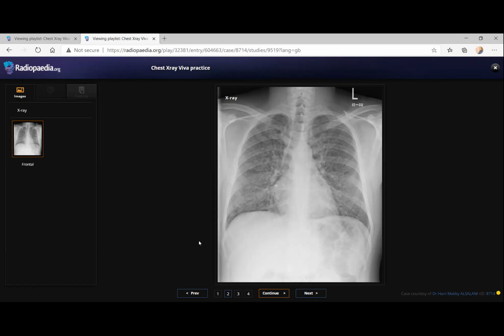No occupational history. Okay. Fine. So my top differential would be a case of Langerhans cell histiocytosis regarding the CT. He's not a smoker. Okay. So it could be also a case of, it's not coming into my mind at the moment.